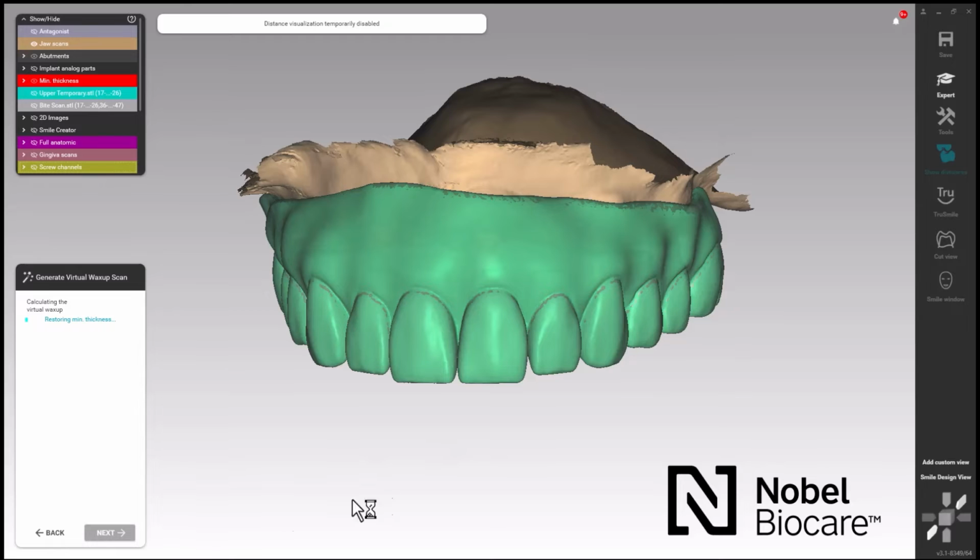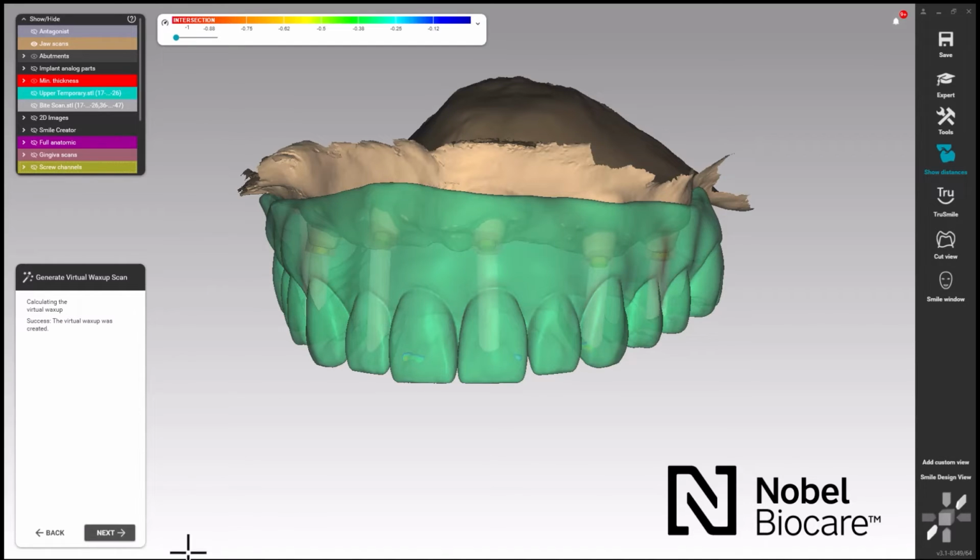It's going to allow us after this to go in and do another freeform. This time we can freeform everything in a merged environment now, which becomes a little bit easier to work with. So we can hit next.